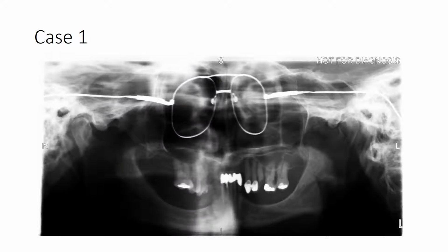So I included this panoramic radiograph because I think it's funny that the patient left the glasses on, but this radiograph also demonstrates areas of coronal decay involving the left maxillary second premolar, as well as the distal aspect of the left maxillary first molar. There are multiple areas of decayed, missing, and restored teeth, and that actually could be a good simple summary of this image. Multiple decayed, comma, missing, comma, restored teeth, period.